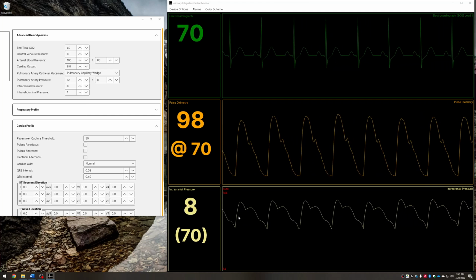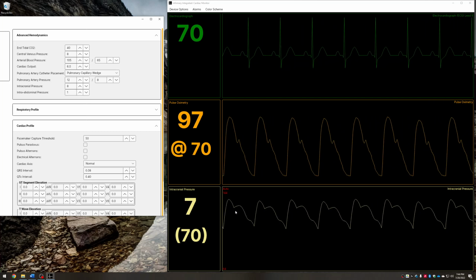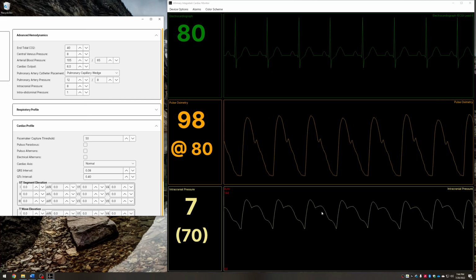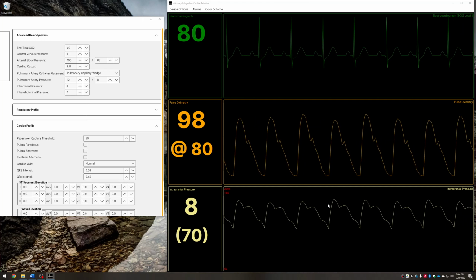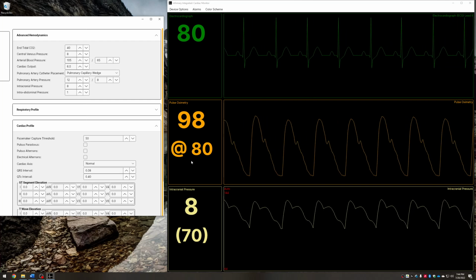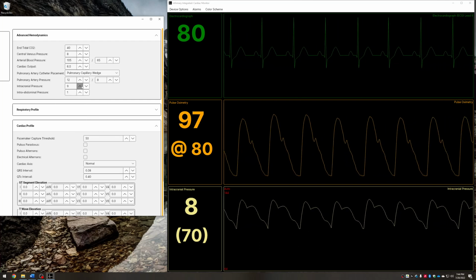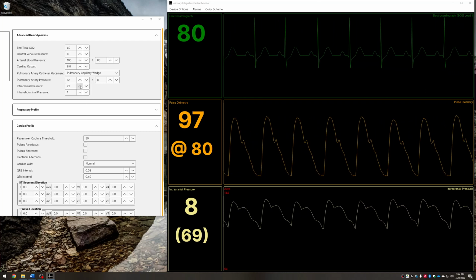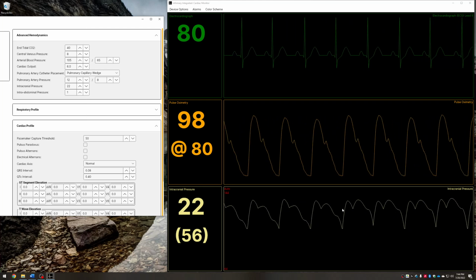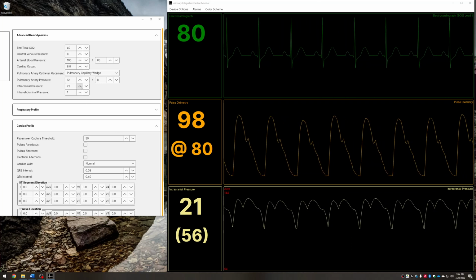The biggest unique feature that Infirmary has about intracranial pressure as well is that as we get to an abnormally high intracranial pressure, much like on a normal human being, the waveform begins to dampen as the actual brain loses compliance for those high pressures. So under advanced hemodynamics, if I start to really turn up the intracranial pressure, we're going to start to see the waveform modeling reducing compliance. And this happens on a sliding scale.